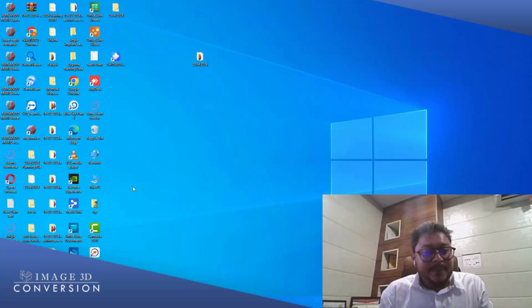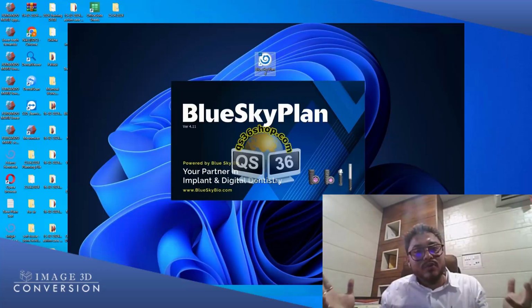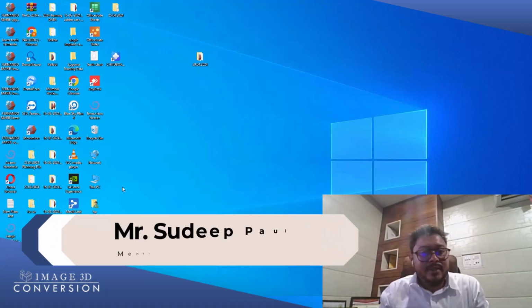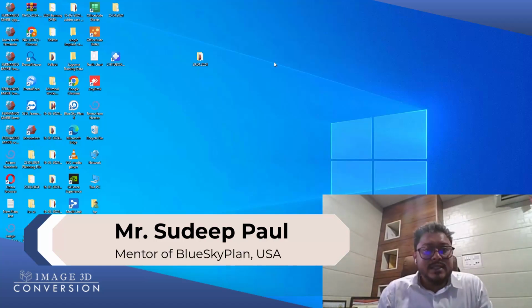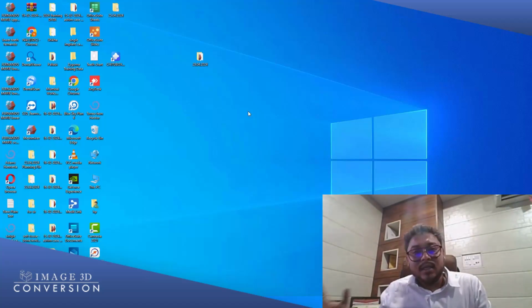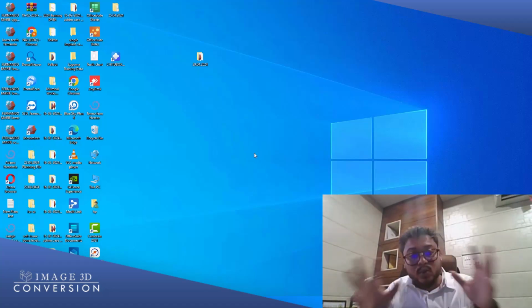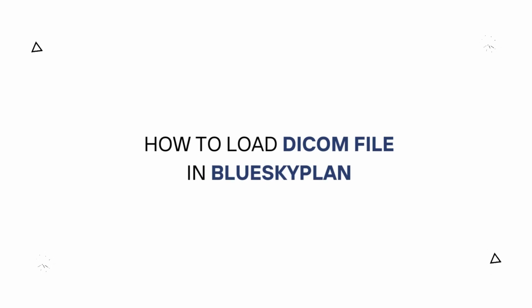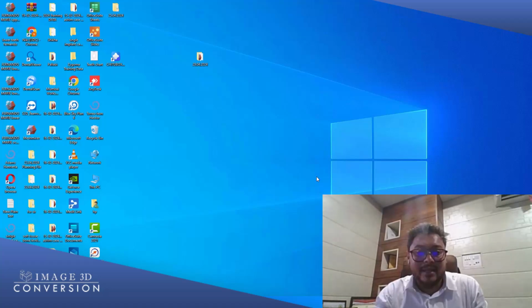Okay, this is the video regarding BlueSkyPlan software, how to load CBCT images into the software, right? Before learning guided surgery planning or any software, we need to understand where we are keeping our files. You need to understand how to locate the folders where you have saved or where you store the Dicom file, STL file and all. I'm going to demonstrate how to load the CBCT scan and intraoral scan using BlueSkyPlan software.